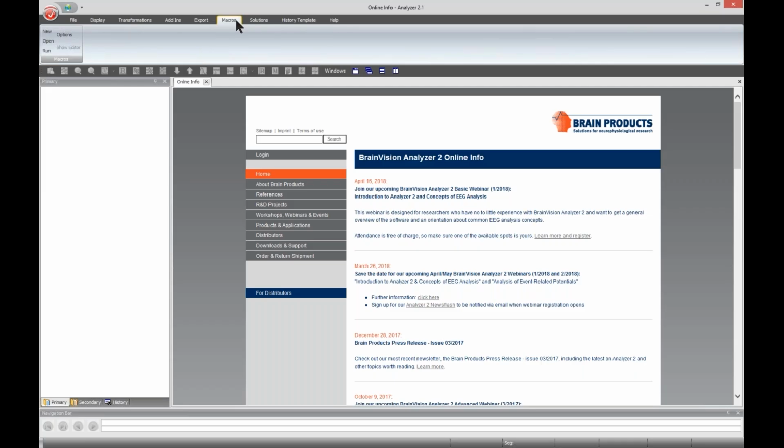With macros, you have the possibility to program your own scripts to expand the functionality of BrainVision Analyzer 2. Macros are written in Sax Basic. This is an advanced option and will not be discussed during this webinar.